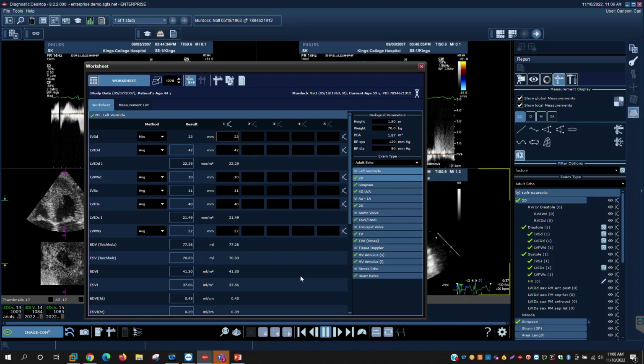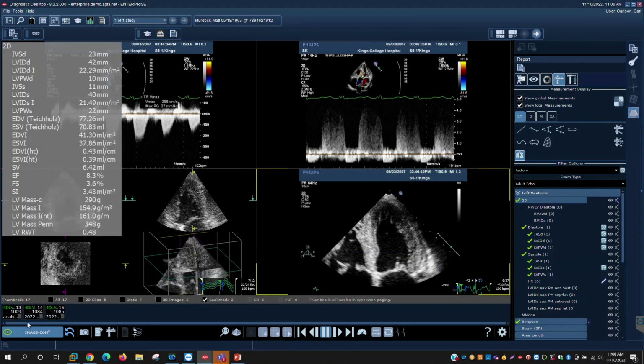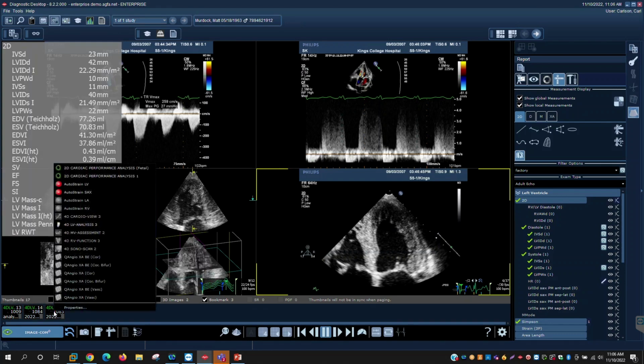In the event that someone modified or took additional images or measurements of those images, then you would have column 2 completed with that particular measurement, and then you can determine which one of those measurements, or an average of those measurements, you want to update the report. So I'll show you a couple of quick measurement options here within our application, and then some of the advanced applications such as a bookmark, perhaps that we wanted to do a quick LV analysis.